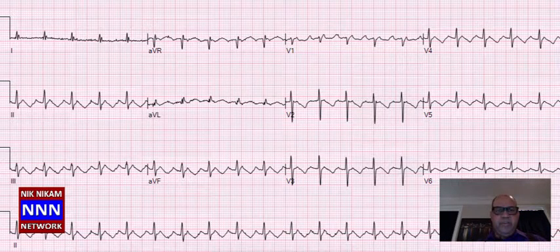tachycardia. If the ventricular rate is 120 or 130, the atrial rate is about 240 to 260. So what fits into a 260 atrial rate? You wonder about flutter. And if you look here, this classic sawtooth appearance is highly suspicious for atrial flutter with 2-to-1 conduction.